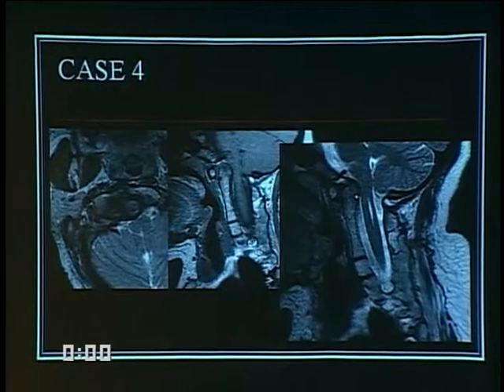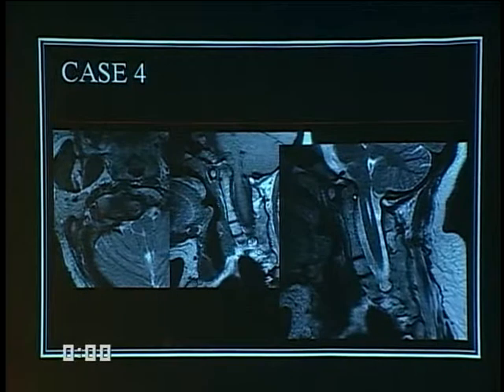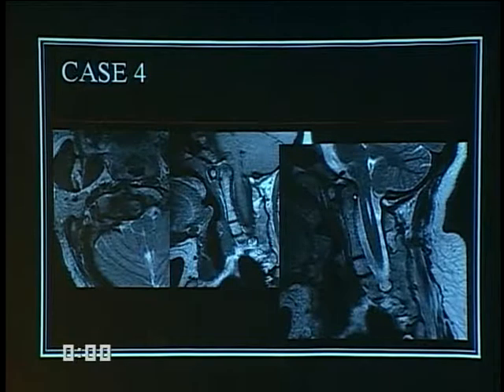I haven't figured this one out yet either. I have no idea why this woman's dens is several centimeters long. But I thought I'd learn something myself.